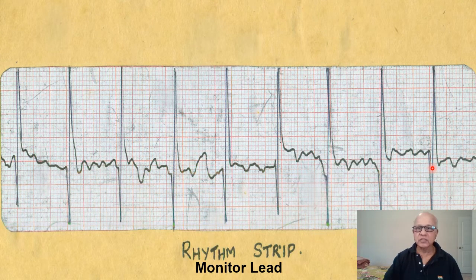So the question comes is, what is this ventricular rhythm? It is a narrow rhythm, it is a regular rhythm, and is occurring at a rate of 100 per minute and is not controlled from above. So it is an accelerated junctional rhythm, right? So this is accelerated junctional rhythm with atrial fibrillation.